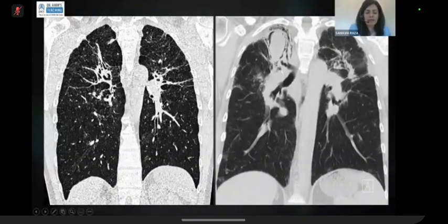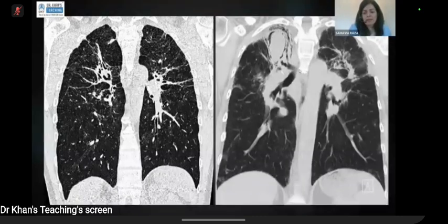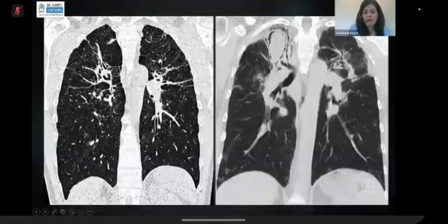What happens in that scenario is that that will ultimately turn into a cavity. You can have a cavity inside a dead part of the lung or a fibrosed part of the lung, and that cavity is essentially a breeding ground for opportunistic infection. So that's what happened in this CT, and that space has actually grown an aspergilloma. So it's a very common complication in end-stage lung disease or fibrosis: when you have cavities, they do fill up with aspergilloma.